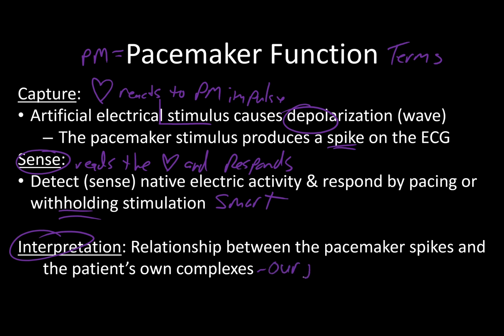Well, the cardiologist, and our job. And we're looking to see the relationship between these spikes and the patient's own complexes. Looking to see that, is it firing when it's not supposed to? Or should it be firing and it's not doing its job? That's really what the interpretation stuff comes down to.